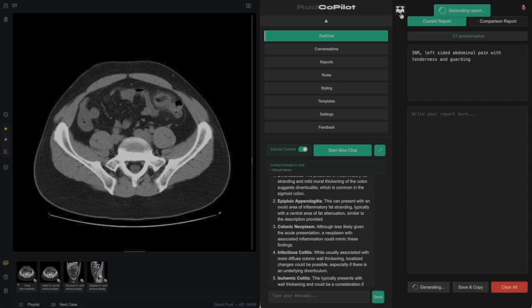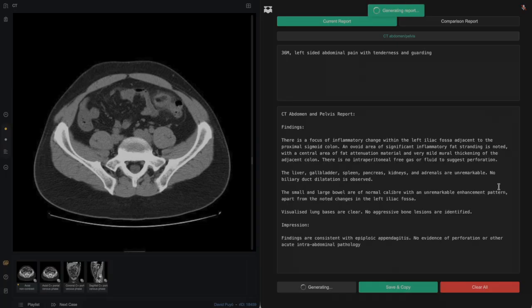Okay, let's generate a report out of this stuff we've dictated. That looks pretty good. Yeah, I'll accept that.